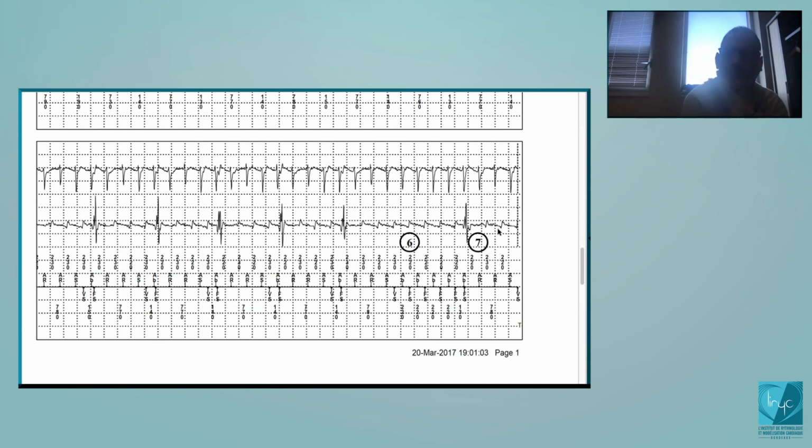And which kind of lead, according to you? Integrated bipolar. Yes, most of the time, if you see these kind of tracings in any books about ICD, it's going to be a Boston device, because the rate of this kind of oversensing is much higher in case of pseudo-bipolar leads. You will sense between the tip of the lead and the coil, and if the coil is placed on the tricuspid or too proximal, then you increase considerably the risk of P wave oversensing.